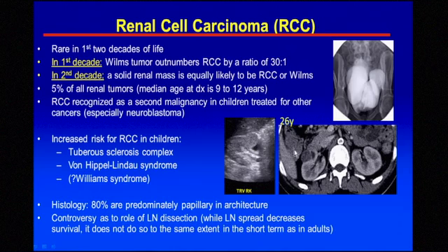They had another imaging study. I don't think it added anything particular, but it proved to represent renal cell carcinoma. You can see the stent in this patient who had aortic stenosis in association with their Williams syndrome. So we have a little group of patients like this, and although the literature doesn't say so, I wonder if we should add Williams syndrome to the group of children at increased risk for RCC.